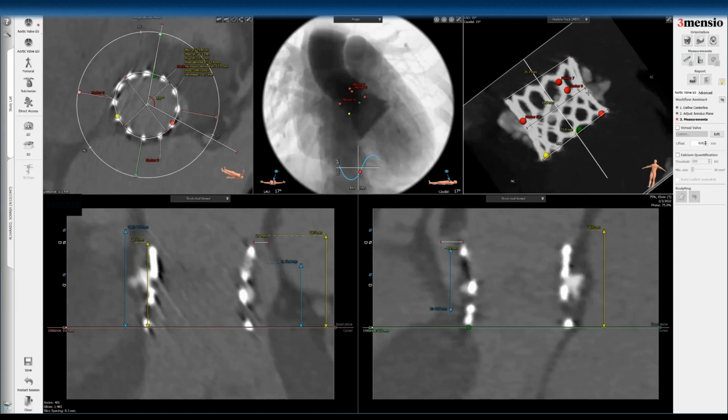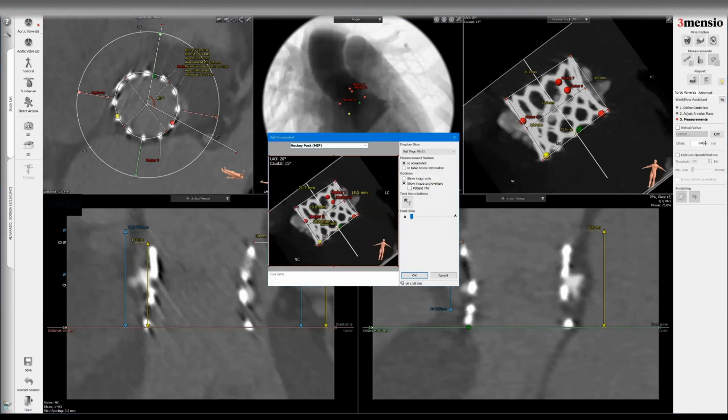And you can see that here, and you can also measure the height. So that just gives you an idea. You can save this. Very busy slide here, but you can see this is a better resolution of your image than the Axo scan or the regular 2D scan. So you can actually get a better idea of your frame dimension, and you can save that.